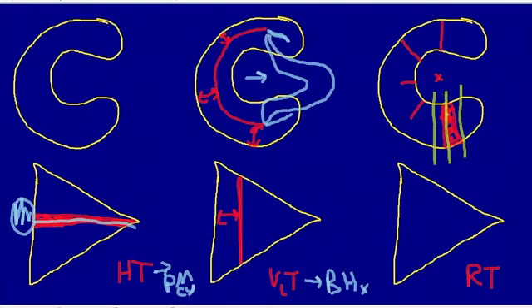I also think about this as almost like being in the eye of a hurricane, meaning that when the eye of the hurricane is here, you don't see it, and then you could see it when the eye of the hurricane moves out. Similarly, if you had a plane that was parallel to a partial thickness radial tear, for example, this one, you would expect to see basically a truncated portion of the meniscus, meaning that you would see what looks like a trapezoid, and this tip of the meniscus will be absent. So when you see a truncated portion of the meniscus, that's another sign that tells you that you're probably looking at a radial tear.